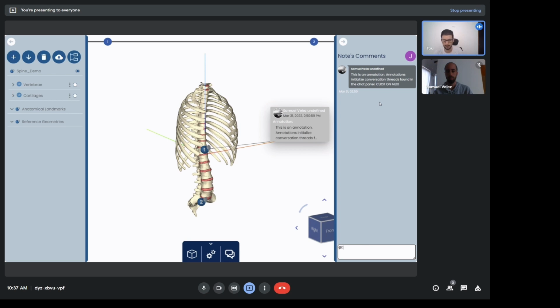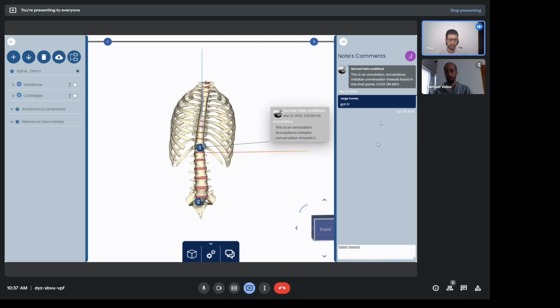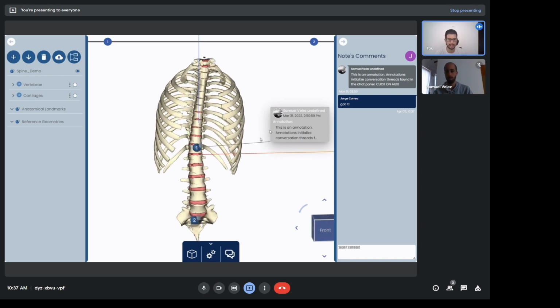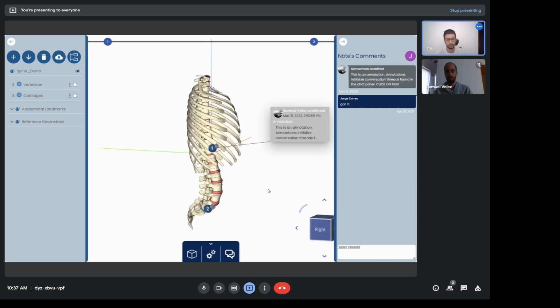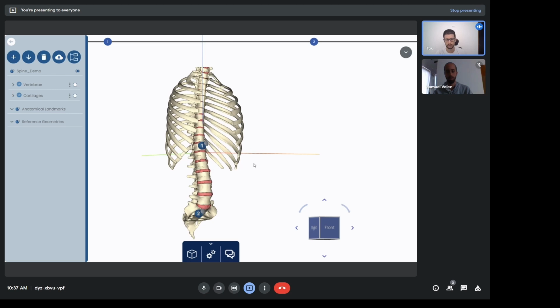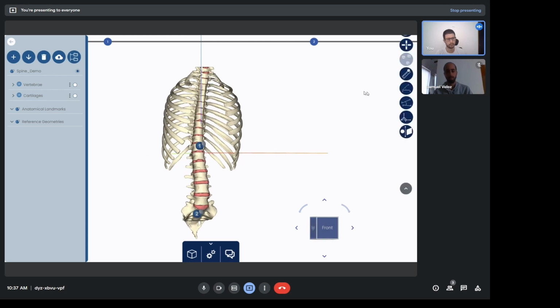Right now we're making trivial chats, but in real cases, this might be an important channel of communication from the doctor to the engineering team, and they disaggregate the topics into different places that are important in the planning of a surgery. So that's one of the important tools that we have in this version of DISRP.